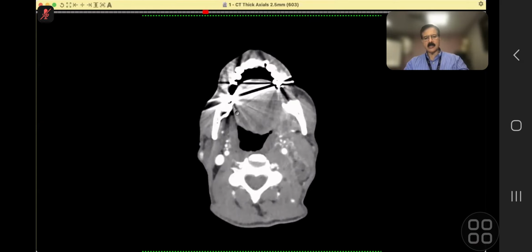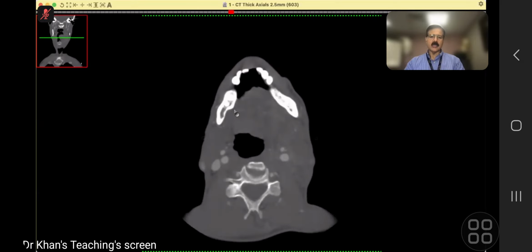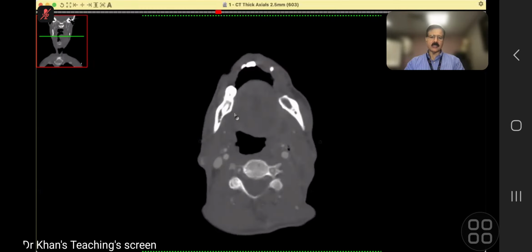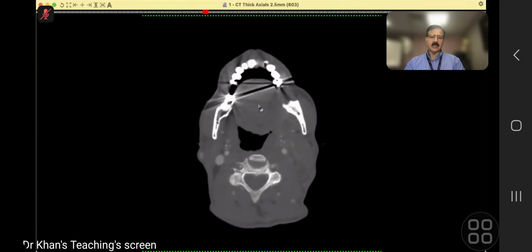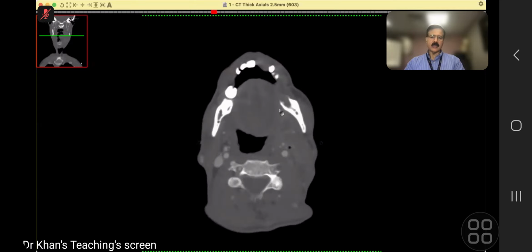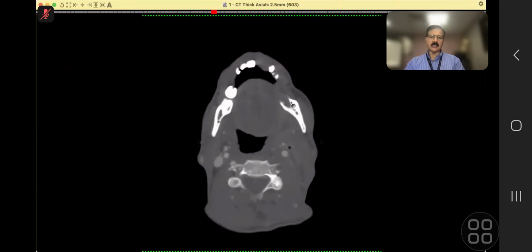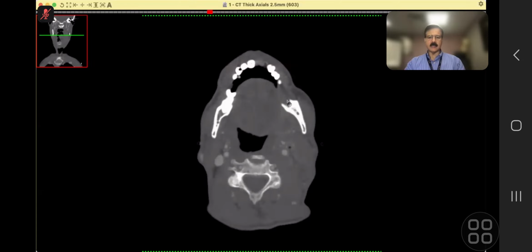So what is happening? Dental should be up there as a cause. And of course, you can ask for bone window. And I'm not showing you coronals or sagittals where you can see the same thing, though there are dental artifacts. But if you look carefully, look at this one. There is nothing in this socket, and there is this abscess actually sitting in the mandible.